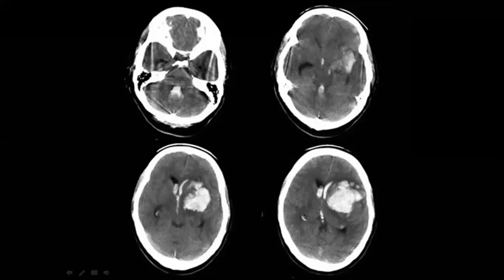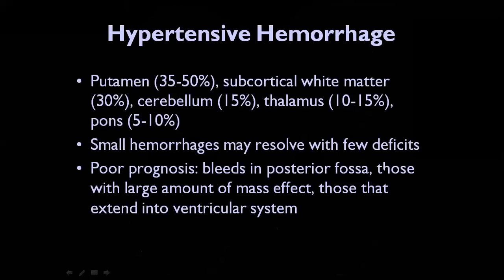This case, I think, yeah. When you have this image and CT, and you find something intraventricular, and it is mostly involving the ventricles, and also the parenchyma, so it can be, yeah, hypertensive hemorrhage.